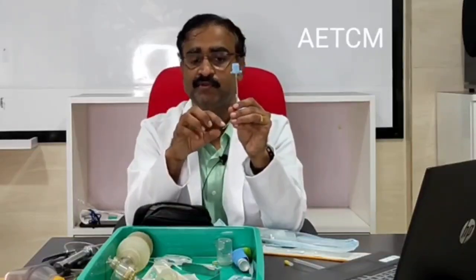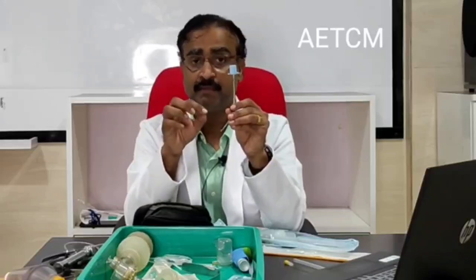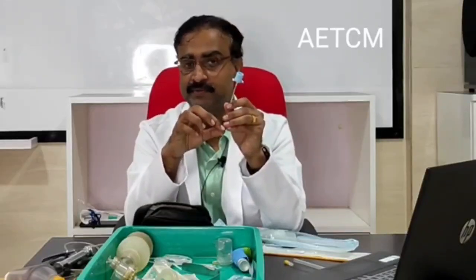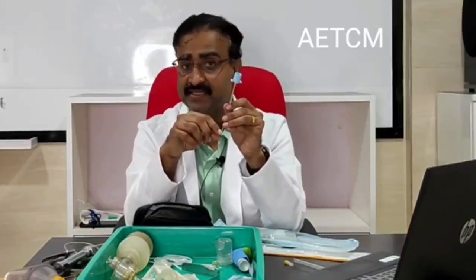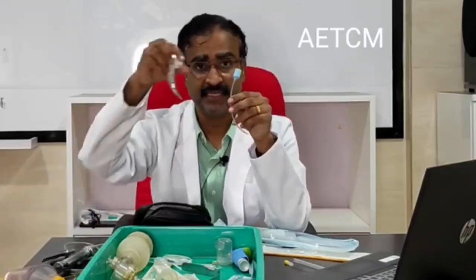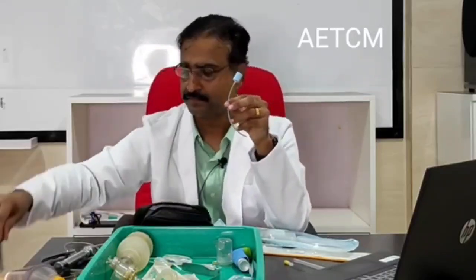If you are able to see this during intubation, after the completion of intubation, it means you are precariously out, you need to probably go in a little more. So this will help you as a guide. You can see that this tube is a little curved. It takes the direction of the air passage, which is a little curvaceous, and that is why the blade as well for an older child is a little bit curved.